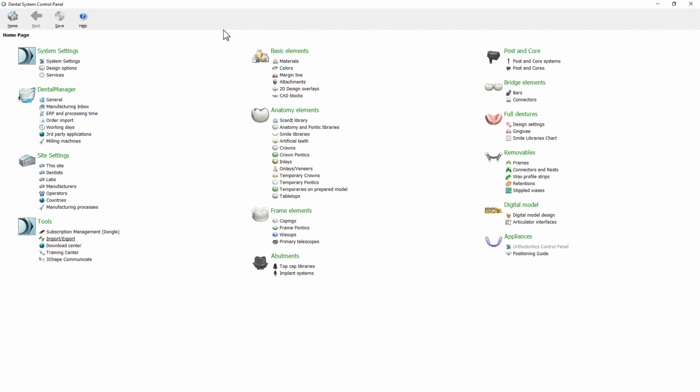The material file is read every time Dental Manager is started up, or when an order form is opened, and the bigger the material file, the longer this will take. Also, generating the CAM output will take longer when working with big material files.